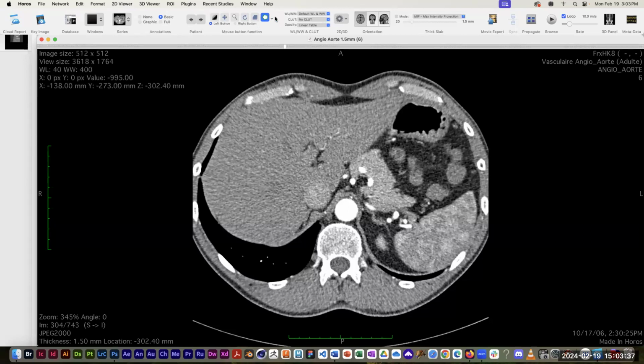All right, so I picked my closed polygon tool. And I really wish that this worked like the pen tool in Illustrator, but it doesn't. It's kind of like the pen tool in Illustrator, but not really. You create a series of anchor points, just like you do in Illustrator, but there are no handlebars. So what we're going to do is play connect the dots, draw little dots all the way around the kidney, and it's going to guess the curvature just based on where the dots are located. So you can't drag anything out to create the little control bars like you do in Illustrator.